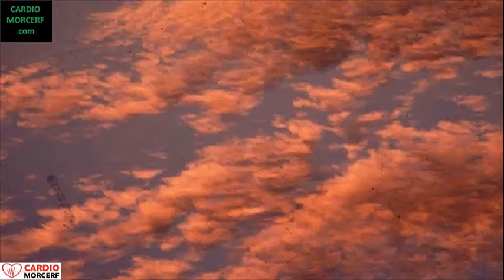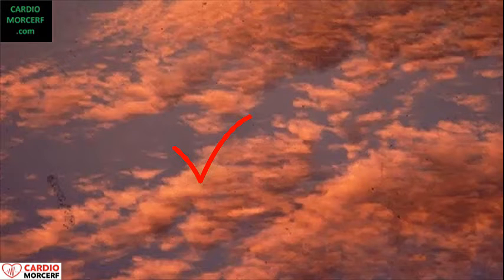and here too. A vegetation of endocarditis will have an internal structure appearance at M mode that looks like a cloud or cotton. There are none or poorly defined internal lines. It looks like a smudge. This is the aspect of the ragged or serrated torn paper sign. Just take a newspaper and look at its edge. That's how the border of a vegetation, no matter if big or small, looks.